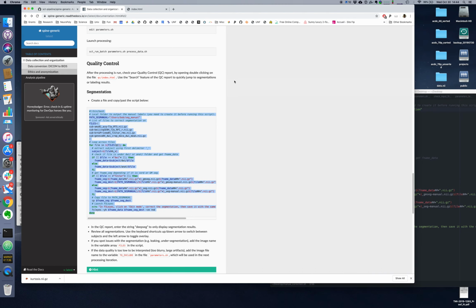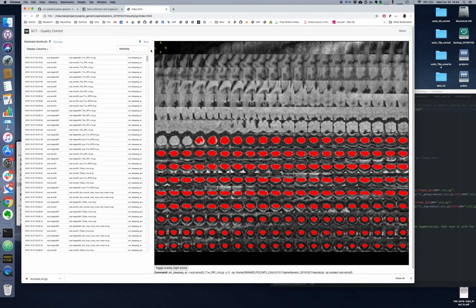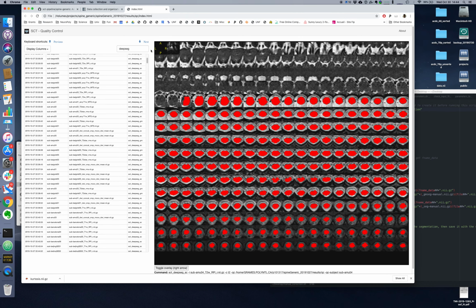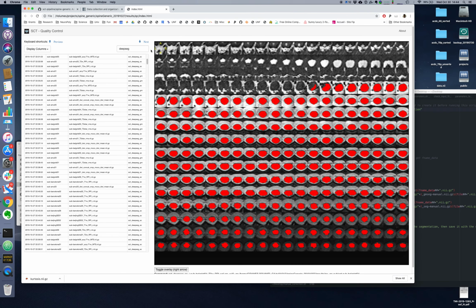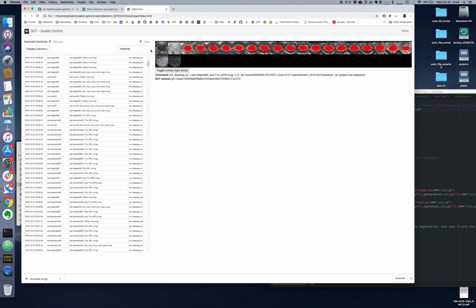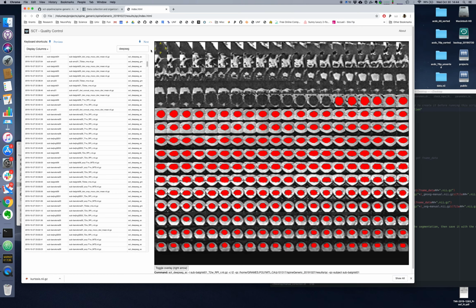So you need to go through the QC report. Basically go through all the different subjects, and each time you notice something that is really wrong, add it. If it's only a small leakage or under-segmentation that appears only in one slice, don't bother. We are really looking for major segmentation issues here. Note that you can toggle the segmentation by using the right arrow. So it's quite helpful in some cases.